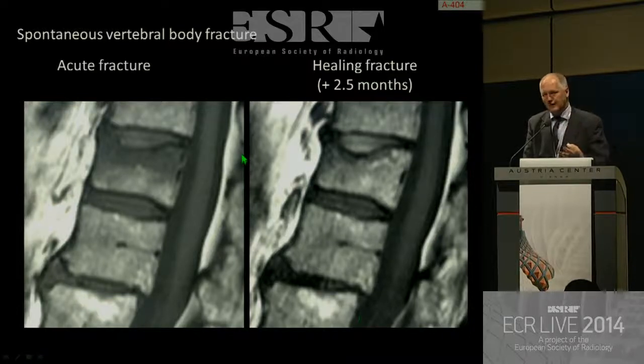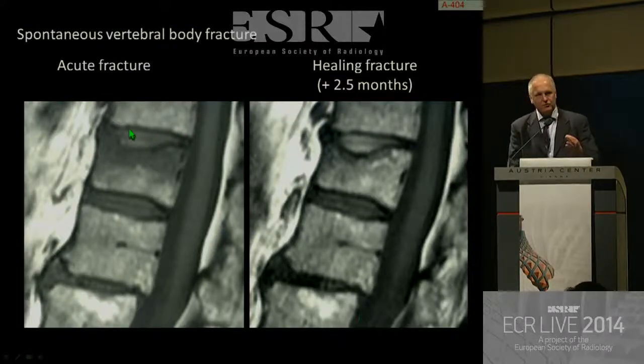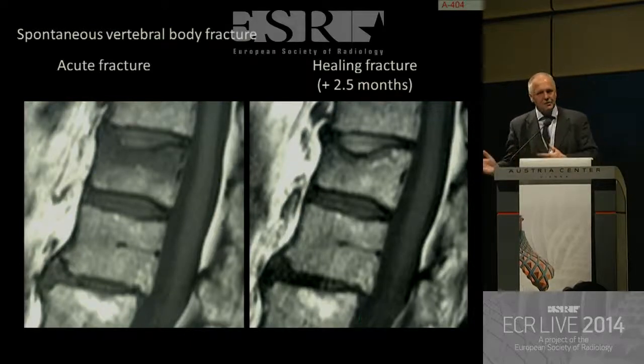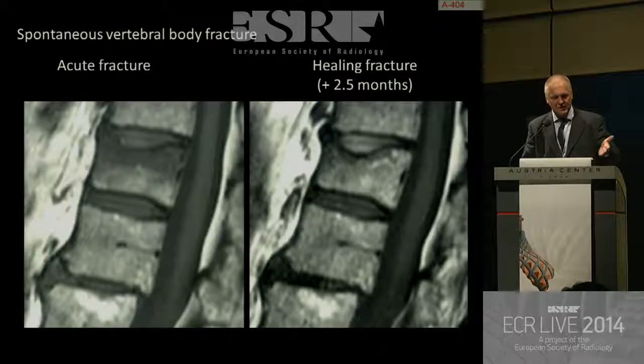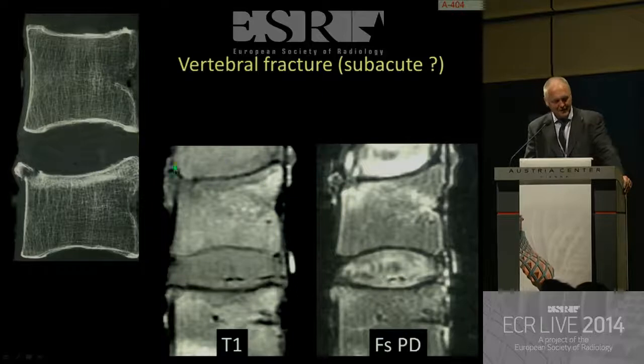On purpose, I deleted all fat-sat images from this talk because what I tell you is applicable on T1 and on T2. It's another lecture to focus on the fat-sat, but fat-sat is dangerous if you want to characterize a lesion or detect healing, as in this patient. A section from a cadaver, sagittal T1, fat-sat, edema. Look at the line. Well, the line is better seen on the T1 than on the fat-sat.